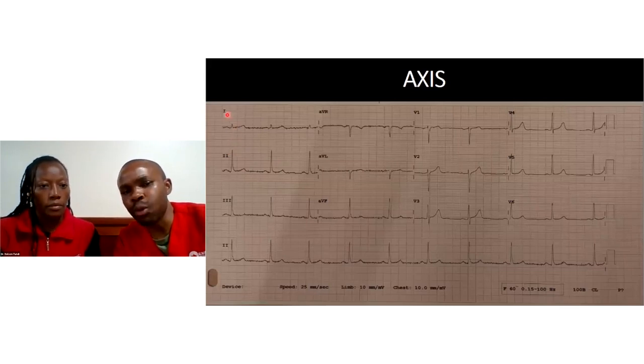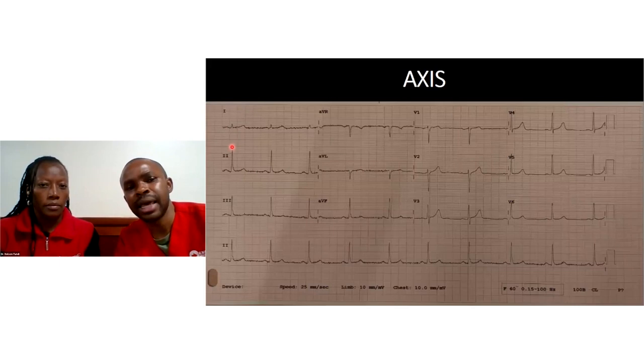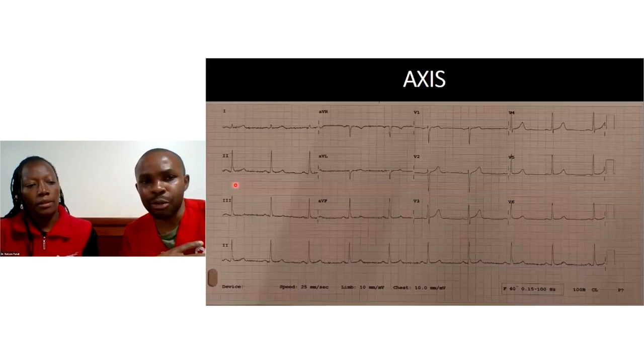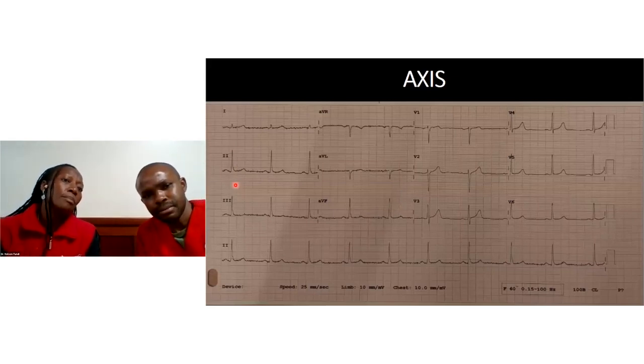We should have lead 1. And I think in the next presentation, we'll review this, because I can also see comments on the various leads: we should have the QRS complex in lead 1 being predominantly positive. That's there. And also we should have the QRS complex in lead 2 being predominantly positive. And that's what we expect in a normal axis. Sorry for that, let me interrupt. Yes, please, go ahead. Could you please tell us what you mean by saying negative?